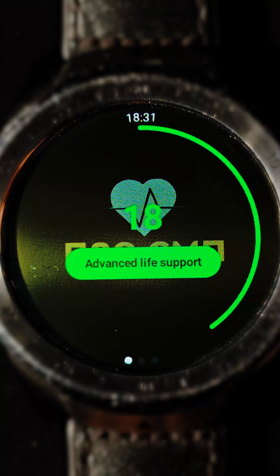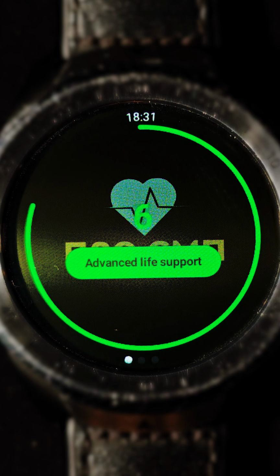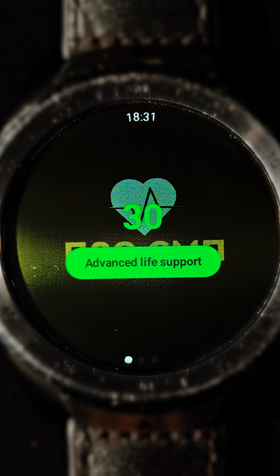During the first launch, the app may lag a bit because the watch needs to load some extra data in the background. On subsequent launches, the application won't need to load anything and will work without any lag. On the first launch, the basic CPR screen will appear. In this mode, only the metronome for chest compressions and pauses for breaths in a 30:2 ratio will be active.